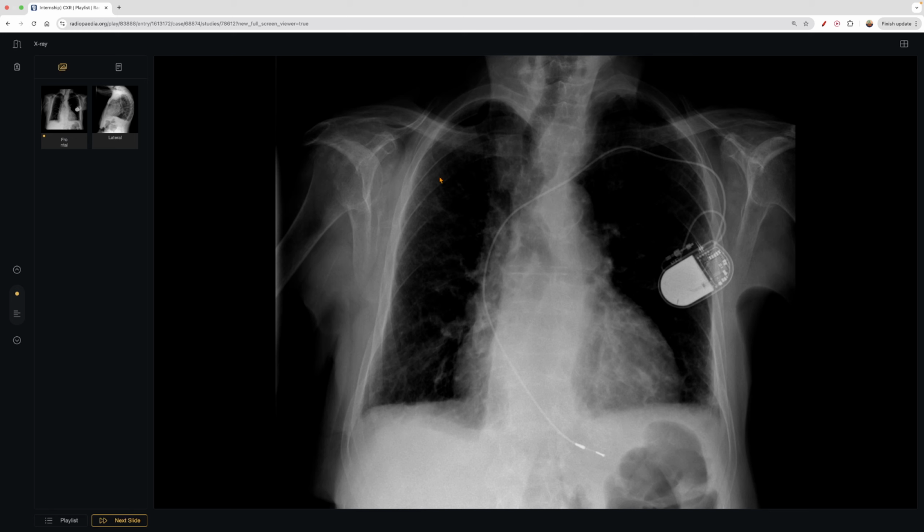And the lungs, you can barely see what's going on. They're super lucent, being super dark, hypodense. Hypodense is dark. Hyperdense, you can see the midline structures, and you can see something radiopaque like these markers and this device, you can still appreciate that, but everything else you can't really appreciate. And that's no good for determining if there's anything going on here. You wouldn't want this image to see if there's a mass or nodule, right? You would just say this is inadequate.